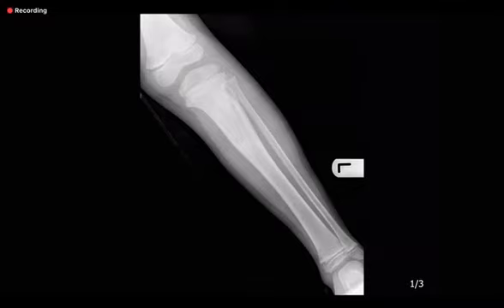Okay, so we have a radiograph of the left tibia in a child, and in the proximal diaphysis, I can see a lucent lesion within the medullary cavity with ill-defined borders. There's an impression of an increased periosteal reaction, which is smooth. Appearances are in keeping with a non-aggressive lesion in the left proximal tibia. I'd like to have a look at the lateral to further characterize this lesion.